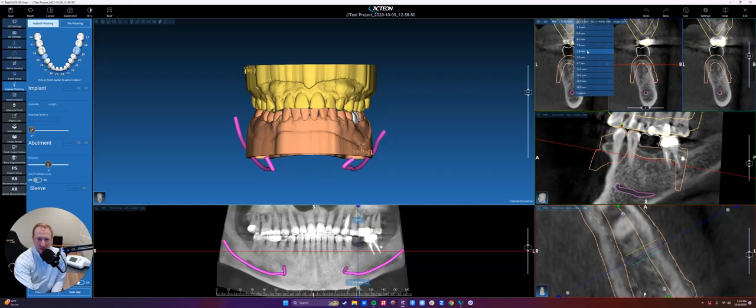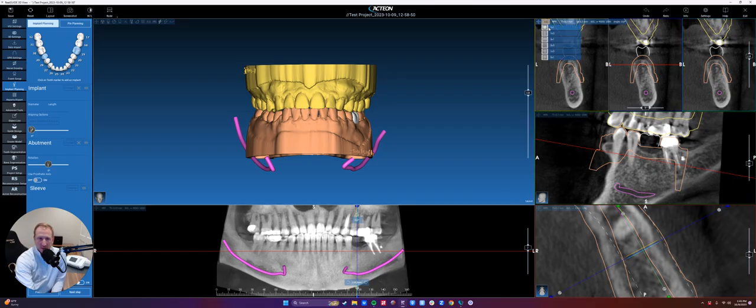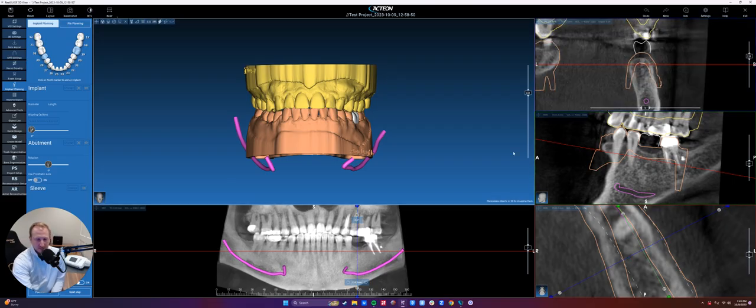We can change the spacing to 5 millimeters and notice how they get further and further apart. So most people are using them in pretty tight, so we'll keep it at 0.3. And then as we're scrolling through, you'll be able to see maybe the entire implant, mesial, distal, and center in one shot. Okay, I'm going to put that back on 1:1 for now.